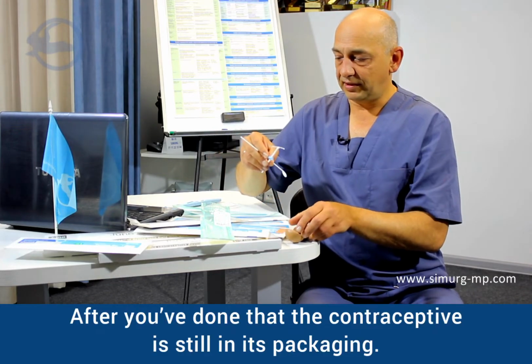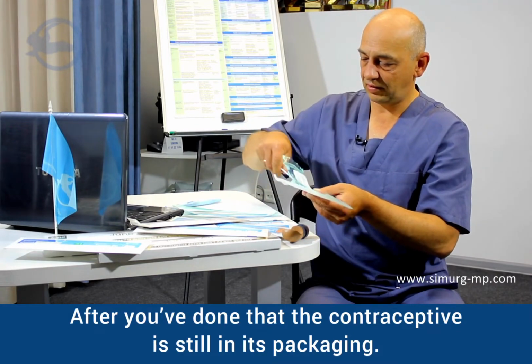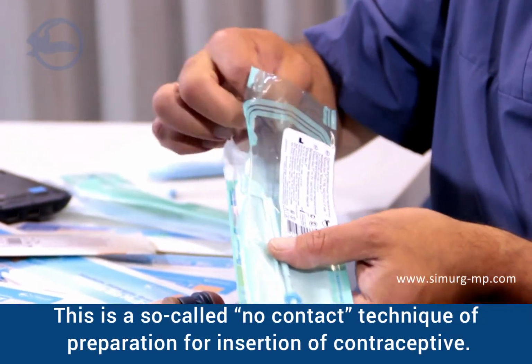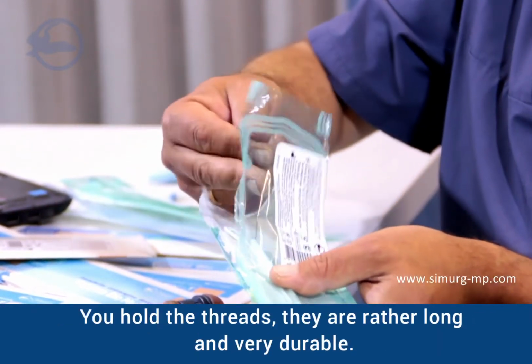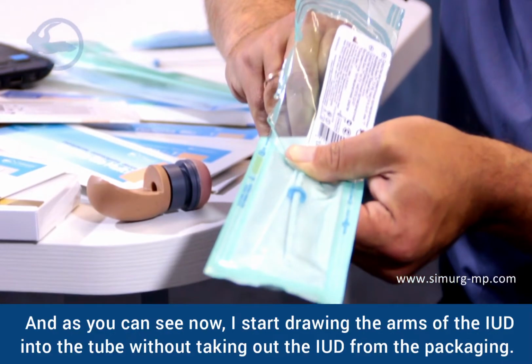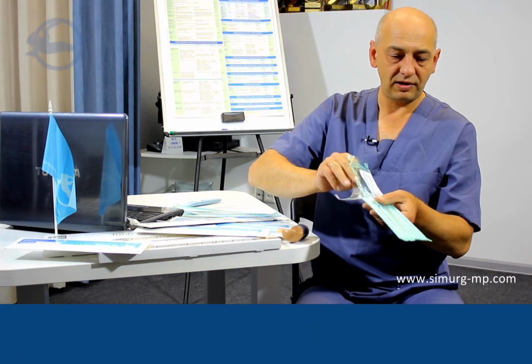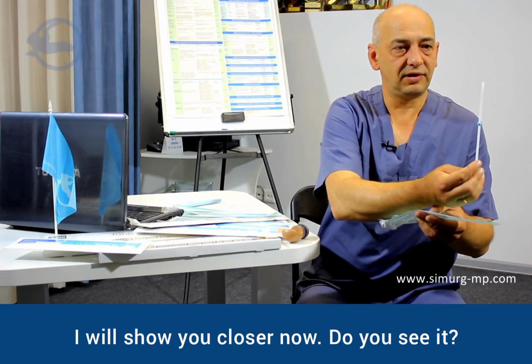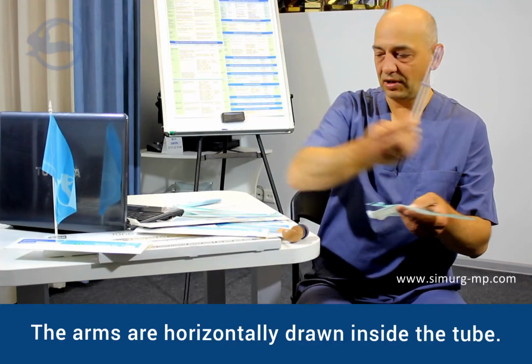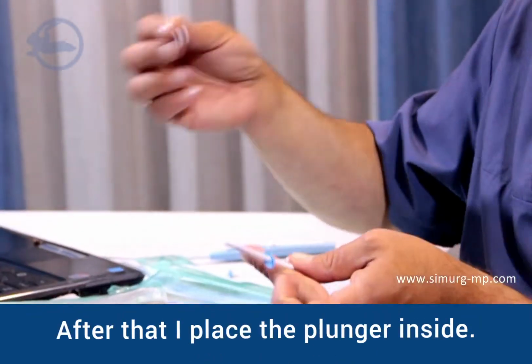After you've done that, the contraceptive is still in its packaging. This is a so-called no-contact technique of preparation for insertion of contraceptive. You hold the threads, they are rather long and very durable. You wind them a little bit around your finger, and as you can see now, I start drawing the arms of the IUD into the tube without taking out the IUD from the packaging. I will show you closer now. Do you see it? The arms are horizontally drawn inside the tube. I didn't take out the contraceptive from the packaging fully. After that, I place the plunger inside.